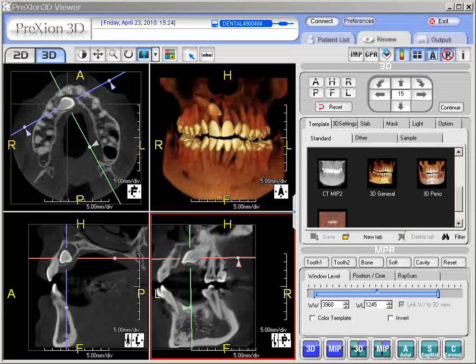User can add text or an arrow to label the area of concern. To demonstrate that, we have already selected through the Alt key an area in the upper maxilla, and we've included it for the axial, coronal, and sagittal planes. However, one may just wish to add simply an arrow.